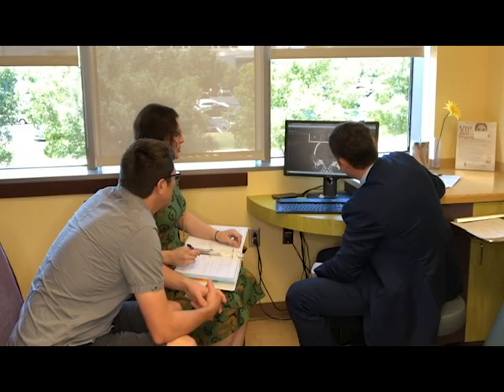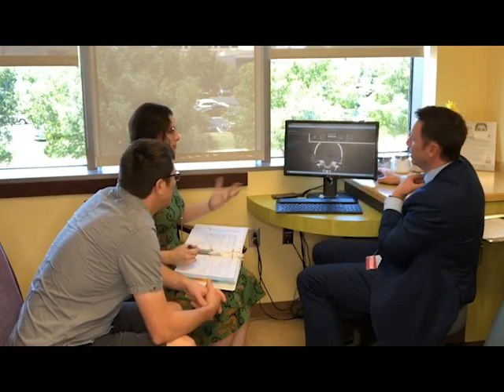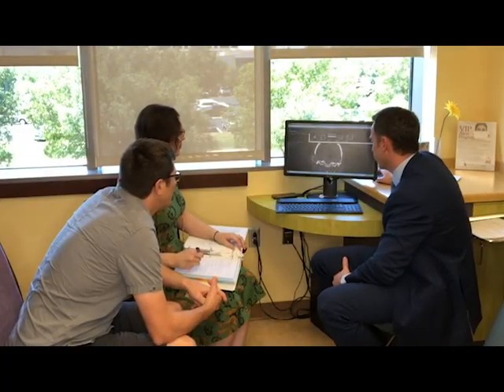Would an MRI better show that? Probably not. CT, in fact, shows the bone. MRI will look for a few different things, but this is actually a great study to start with because it's such a bony lesion, and CT is really good at looking at bone.